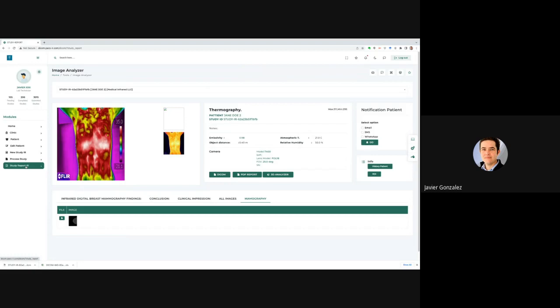Okay. And then, for example, I can email you the report, and you should get that PDF report in your email. Look in your spam folder, because I think it's sent from a weird address. Gotcha. Okay.